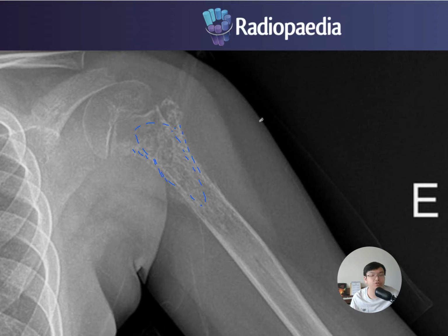So how can we deduce whether there is extraosseous soft tissue components? This is an extremely important clue for Ewing sarcoma, as I've just mentioned. Should be a very sizable one, okay? Before we can judge that, basically we need to know some anatomy of the soft tissue around the region that we are actually assessing. For example, just now I told you that there is usually a fat plane outside the periosteum, but you do not see that here, right? There is a loss of the fat plane, and then you start to realize that actually the entire shaded area is an extraosseous soft tissue component, okay?